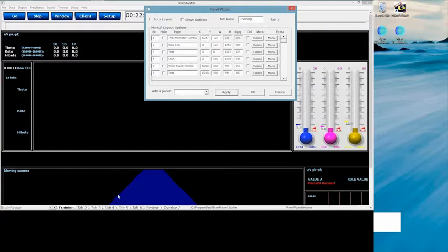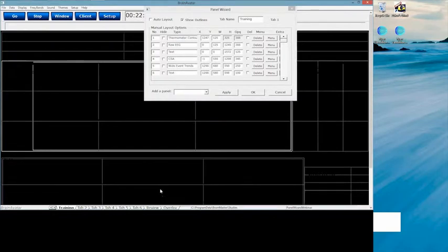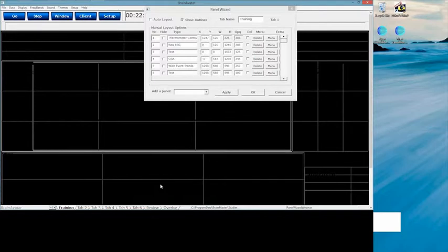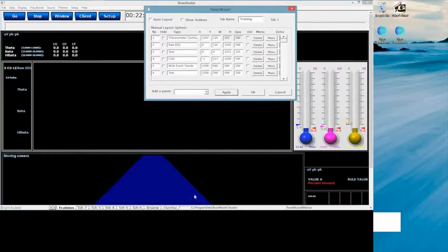Well, what I'm going to notice is that the CSA is about 345 in height, 1298 in width. So if I hit my show outlines and I bring this up and just not shrink its size, let's see how it fits. Well, it looks like it's still being cut off a little bit, and this is where I use my X and Y right here to fine tune it. As you can see, I was able to basically take it from -1 to 0 right there. Make it a little bit better fitting on that. We're still getting cut off a little bit at the bottom.